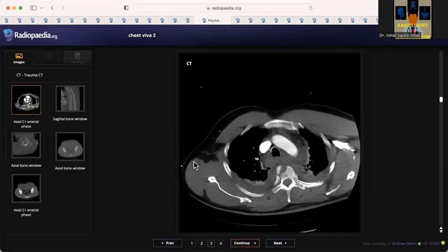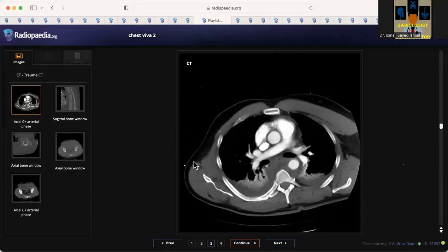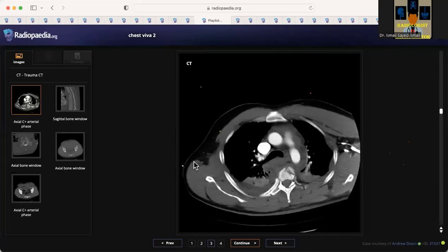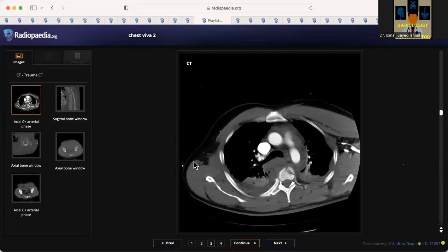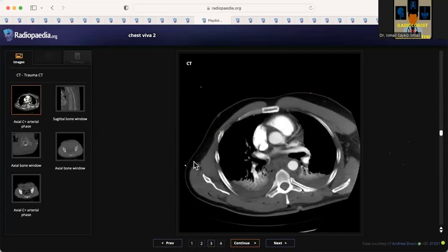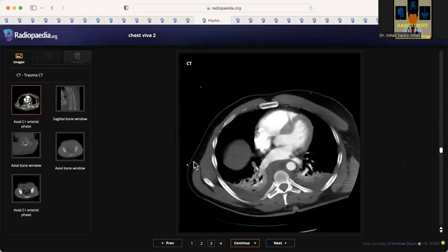I can see bilateral pleural effusion with basal collapse consolidation. So you were suspicious that there is a widened superior mediastinum and there is a pleural capping, yes? So you said you're worried about aortic injury. So comment on the aorta here. Can you see any traumatic injury? In the aorta, I cannot appreciate any defect or extravasation of contrast.